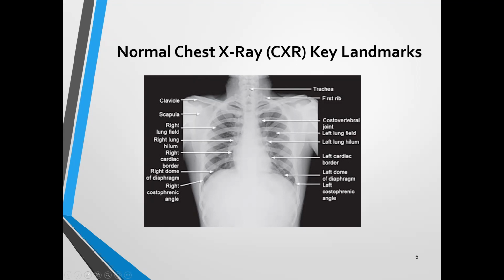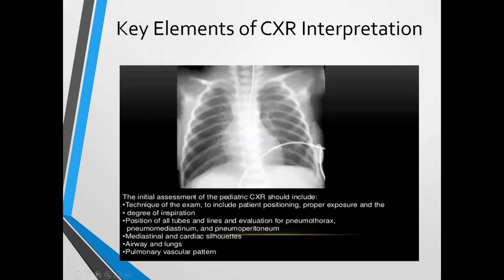In patients that have pleural effusions, you'll see this kind of haziness. You may still see the lung behind it, but you just see this gradual haziness where you have gravity doing its thing and there's fluid buildup in the pleural space, so in between the visceral and the parietal layers. That lubricate, again, the lung to facilitate lung expansion.